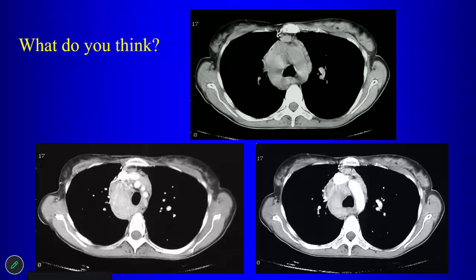If any, maybe mild enhancement. It's a little bit more than mild. I mean, it is enhancing here. Okay, so we have lymphadenopathy that's enhancing there in the mediastinum, and of course lymphoma is in your differential. What metastatic tumors are associated with vascular lymph nodes? Renal cell, thyroid, islet cell tumors, carcinoid, Kaposi's, right?